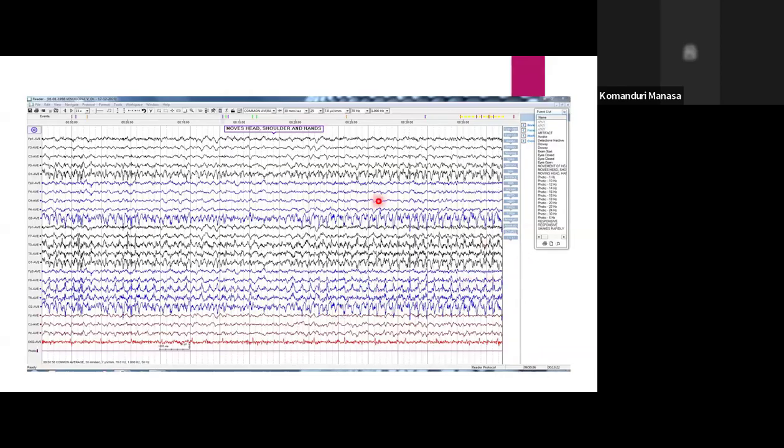Occipital channels, anterior temporoparietal regions, mimicking the same. And you see the reflection between the D4, D6, and you can see an out of phase movement. So theoretically it is hard to distinguish. Evolution usually happens in terms of change in frequency, which is not there.